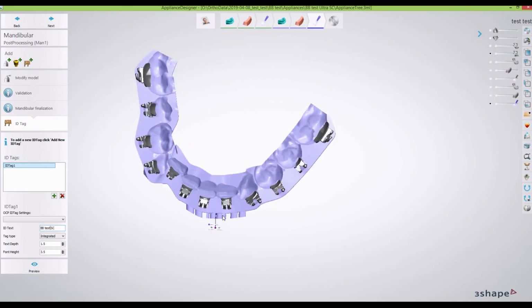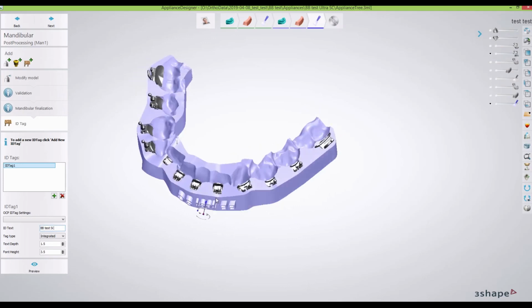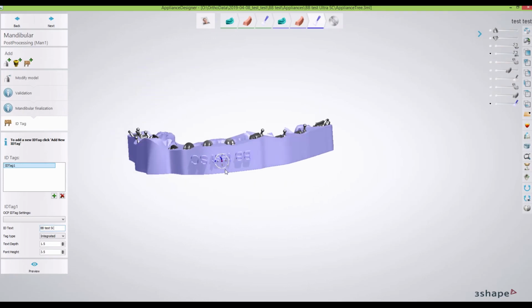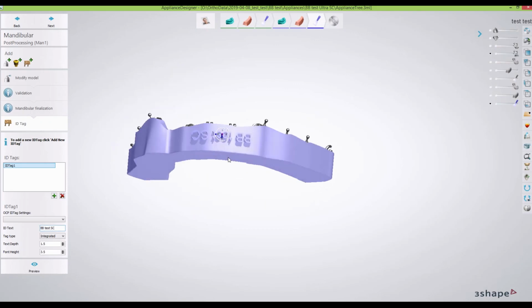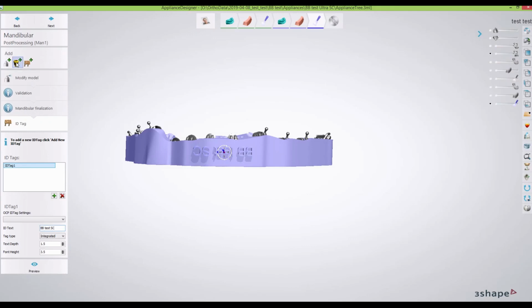And there's another step. This is totally optional, but I helped develop it for a friend of mine who just had a hard time holding on to these little trays. I've got the advantage, I have fingernails. Some people don't. So what can I do? Well, again, this is part of our workflow, so I just want to share it because you probably won't find it anyplace else. If you go up here, these are attachments. It's made to look like an implant or different restorative things, but that's also where, if you were using aligners, your aligner attachments would be.